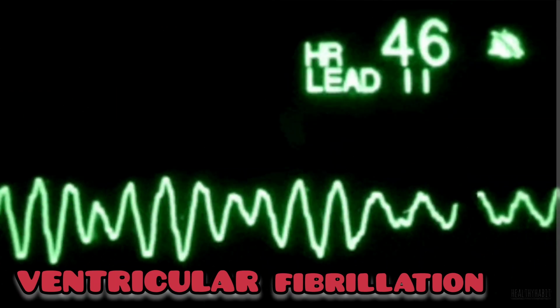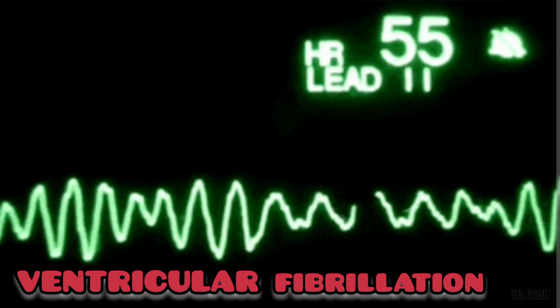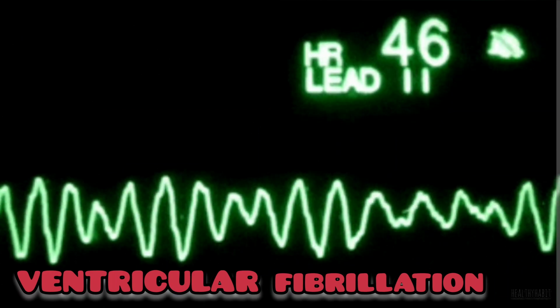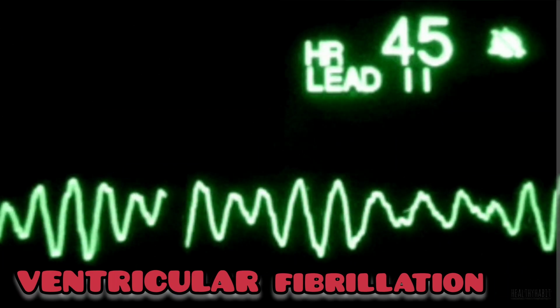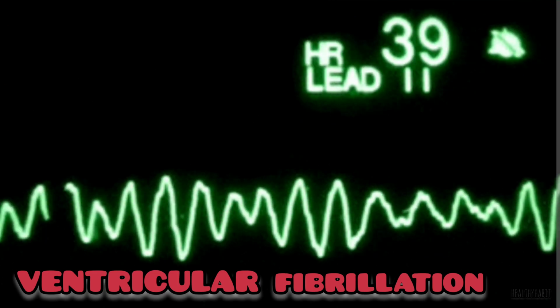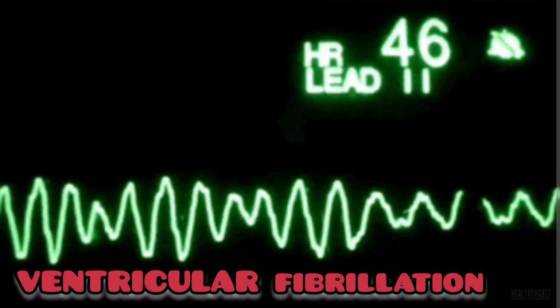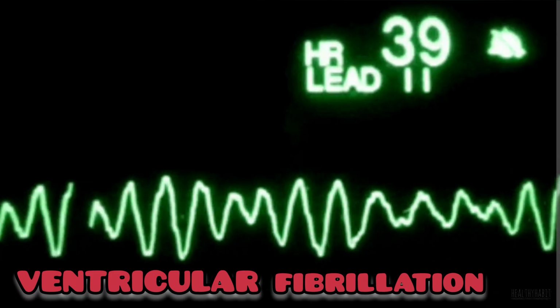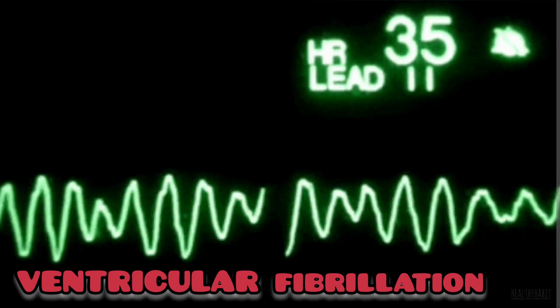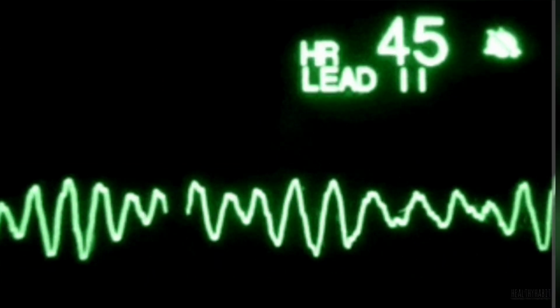Ventricular fibrillation, VF, is the most important shockable cardiac arrest rhythm. It is invariably fatal unless advanced life support is rapidly instituted. ECG findings in ventricular fibrillation: chaotic irregular deflections of varying amplitude, with no identifiable P waves, QRS complexes, or T waves.